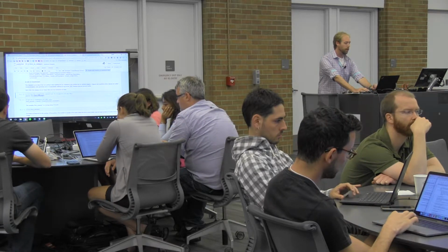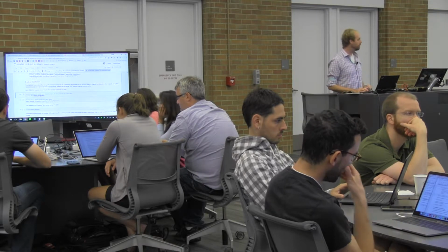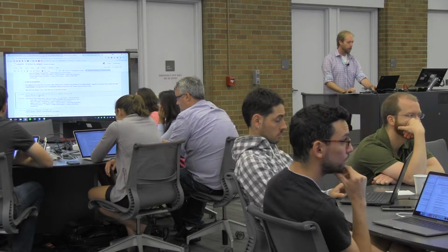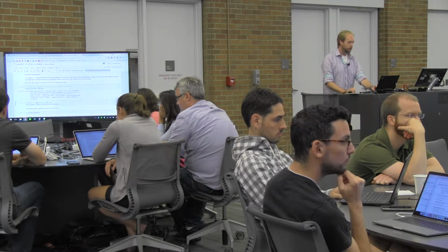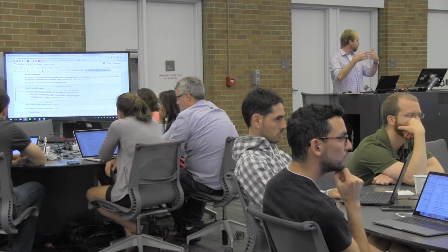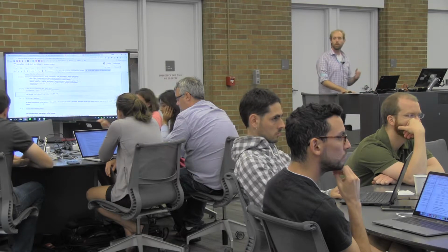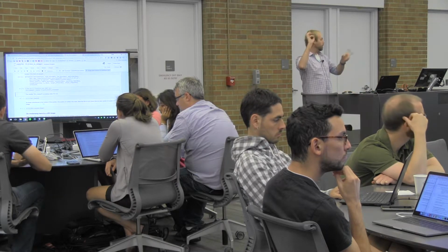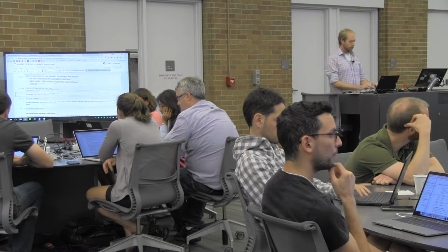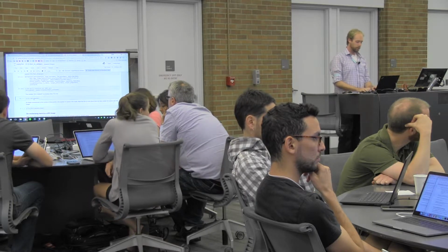So the way that we can do that is by calling the fit method of this masker object, and we can give it either the Nifty object or a path to the file of the Nifty object of our actual volumetric data. And when I call that, it effectively makes sure that the two of these things line up properly. And when I then call the transform function, it's actually going through and manipulating that 4-dimensional array so that it extracts only the voxels that we want, and then ultimately is going to return a subset of those voxels.